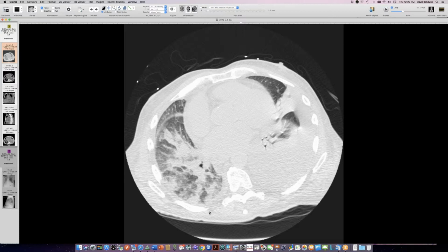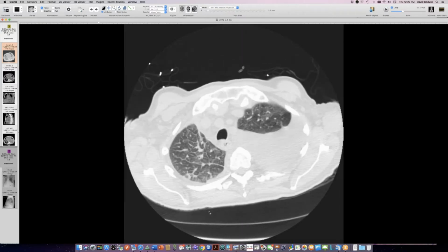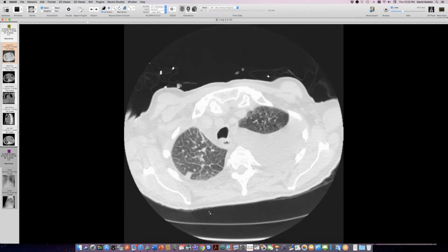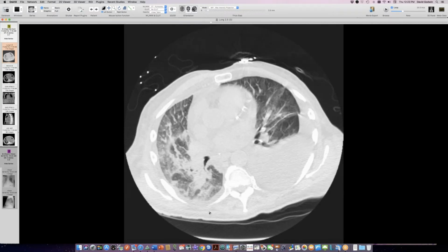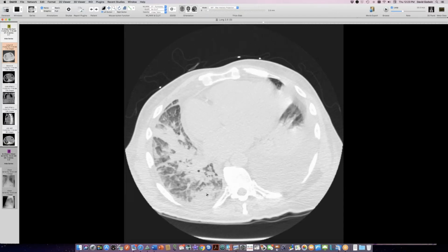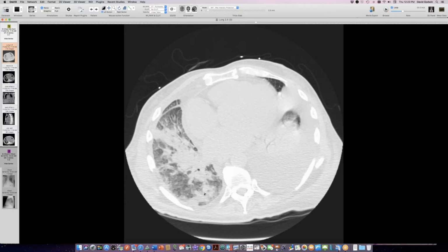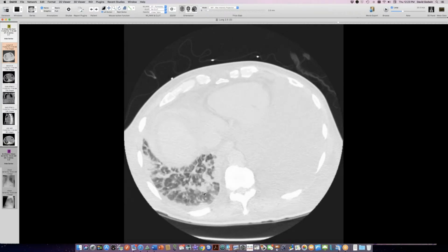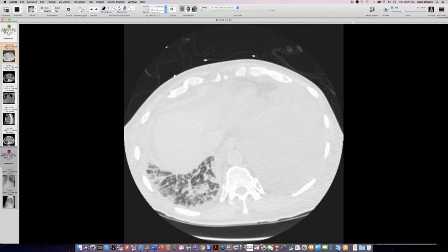So this is amyloid. I think last week, Peter presented some cases of amyloid. And this is a really nice example of the septal pattern of amyloidosis. And then maybe there are some nodular lesions in the bases here, but it's really hard to tell. There's so much atelectasis. I don't know really whether these really qualify as nodules. And then if this calcification is part of this one process and it's not, say, a separate thing like a granuloma, then that could be a little bit of bone that is developing in the setting of amyloid. So, cause of dendriform pulmonary ossification, or sometimes larger blobs of bone.